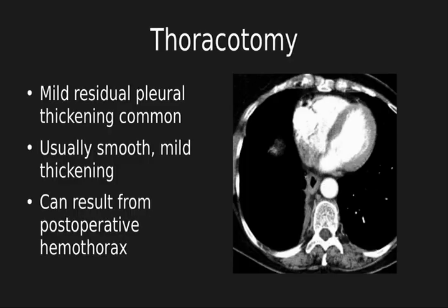Also, patients who underwent thoracotomy may have a mild residual pleural thickening that persists because of the postoperative hemothorax. The blood irritates the pleura, and it usually persists as a mild residual thickening.